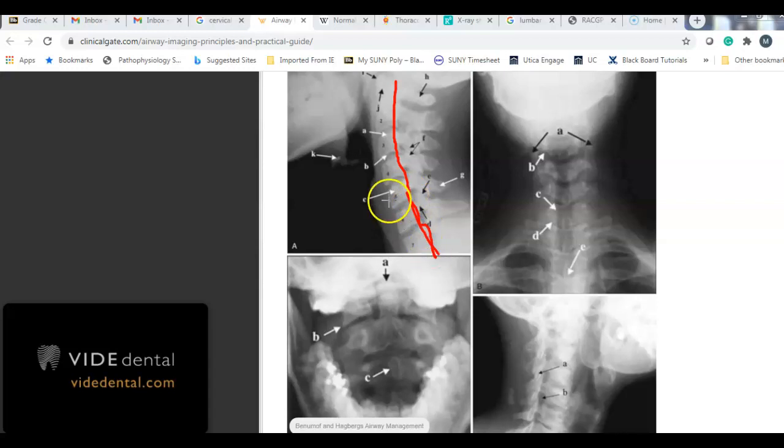good. If you have a cervical fracture, you could have one of these vertebrae that have moved out of place. You look at the PA or the AP view. Generally, this is going to be, I believe, AP in the cervical spine. Those will be aligned. The alignment of C1 and C2, okay? You want to make sure alignment is good. And in order to know good alignment, you need to know the anatomy. But my advice to you is you got your phone.